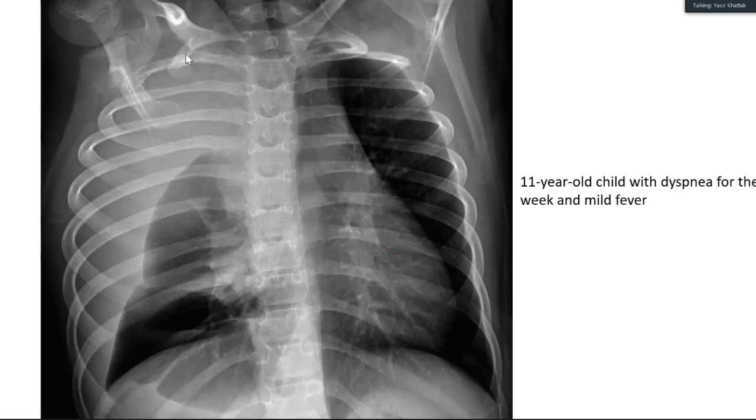Now look at this rib. This is the first rib. True. What about this one? They appear to be thinned out. Thinned out and expanded. Right, that's something wrong. Now, you said that there is a hilar prominence because there is moderate to massive pleural effusion. This can be a completely collapsed lung, which looks like hilar prominence. So, all right.